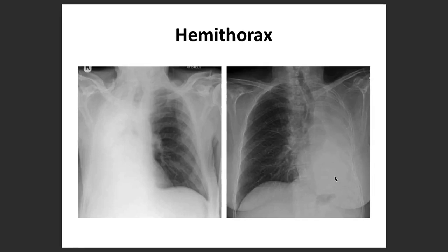Then you will be able to see this towards the opacified side. And the last one, as I was telling you, it remains in the middle: in consolidation, if there is a pleural chest wall mass, or also some combination of pathologies. So these were some of those beautiful examples.